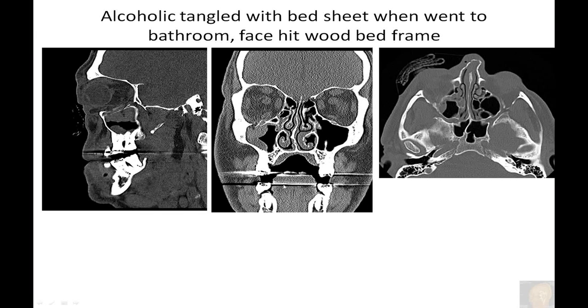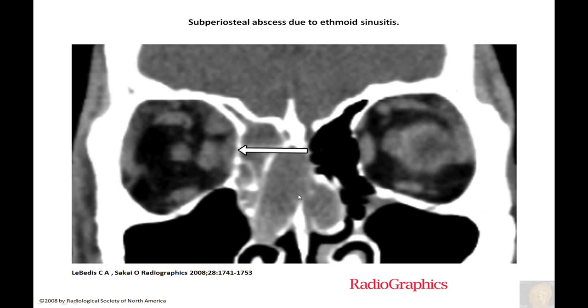These are streaky artifacts from imaging, because of the CT scanning plane, the dental amalgam causing this artifact everywhere. And this next patient, I got from the literature review.